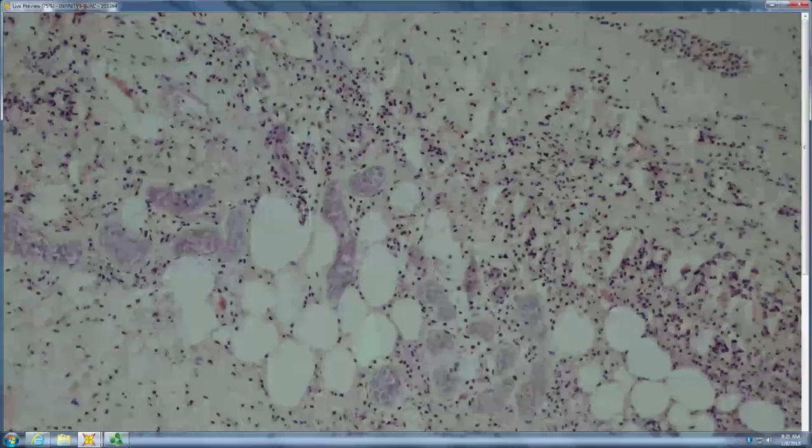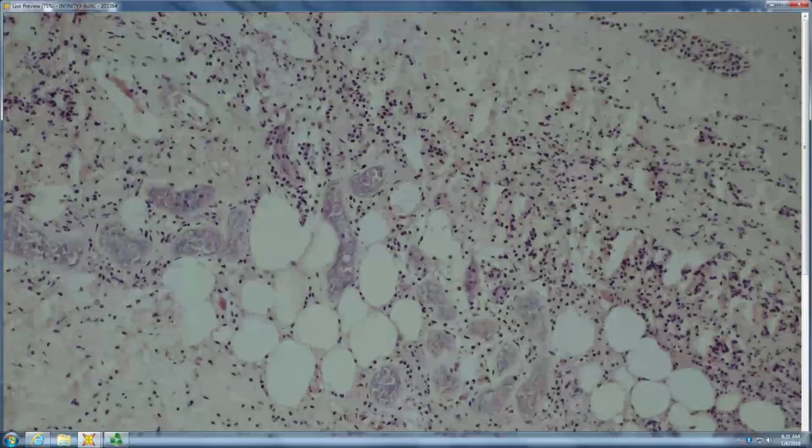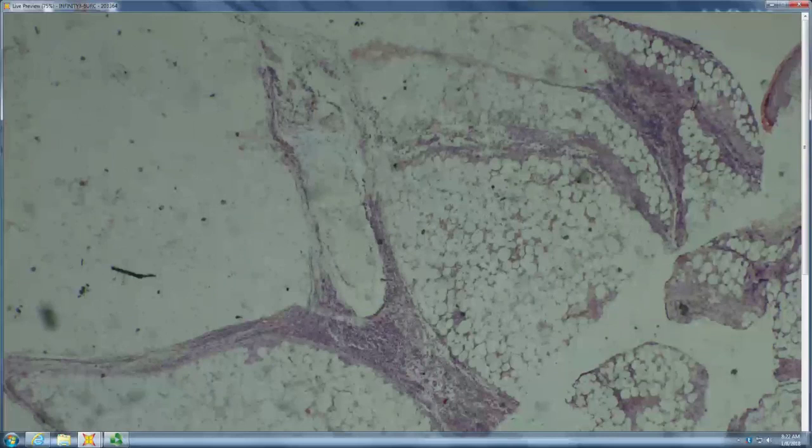You'd also worry about bacterial infection with suppurative inflammation. There's extensive sweat gland necrosis. Right, so that's the sort of thing you can see in a coma blister, but this is awfully inflammatory for a coma blister, right? There are neutrophils within the sub-Q. So what's your differential for a neutrophilic panniculitis?